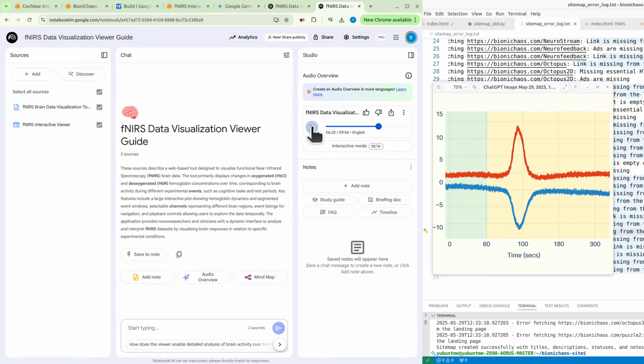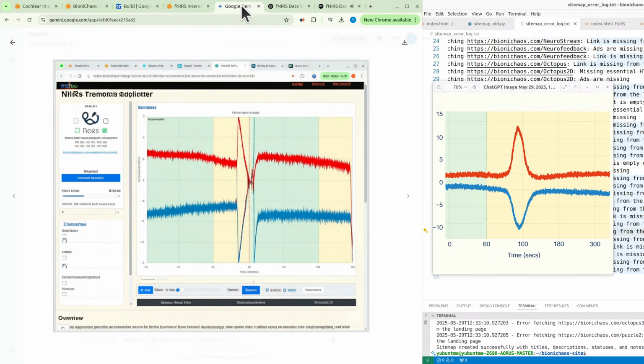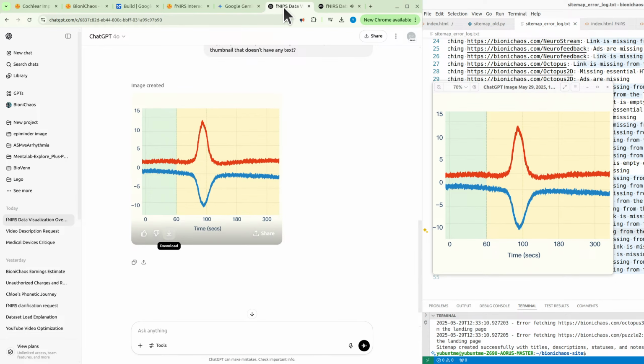Block that time falls into, and how many channels are currently displayed. Keeps you oriented. Okay, this next feature sounds really useful for getting granular, hovering over the graph. It really is. This moves beyond just seeing the shape of the lines. When you move your mouse over the plot area, what happens? A little pop-up appears showing the exact numerical concentration value for HBO and HBR for every channel you have visible at that specific instant in time your cursor is pointing to.